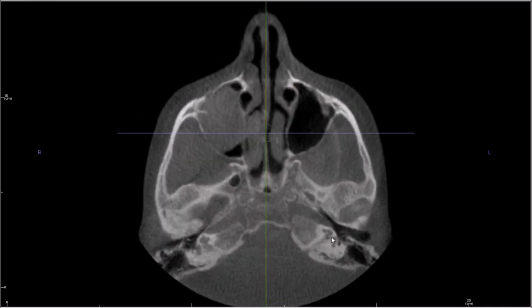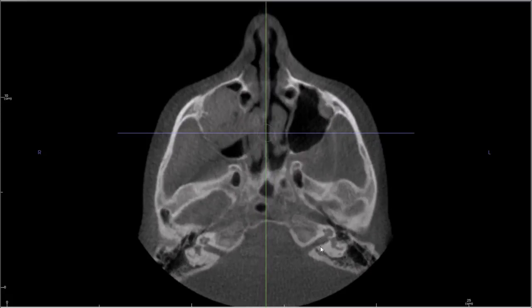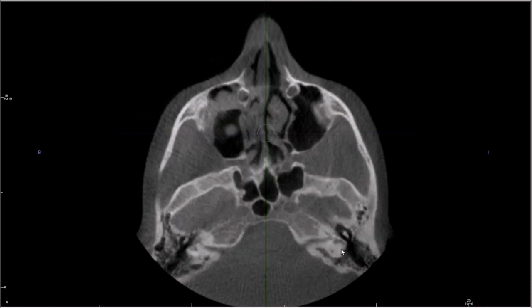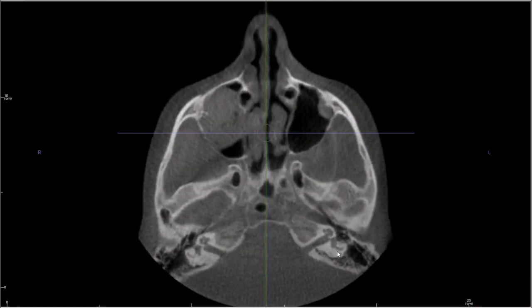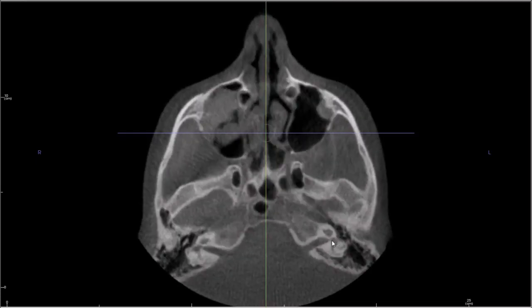So where does that lead us? Leads us into the cochlea, which is right here. You want to make sure that looks normal. And following in from the cochlea is the internal acoustic canal, or internal auditory canal. That's where the vestibulocochlear and the facial nerve travel. And then posterior to the cochlea, you see these little tubes that kind of wrap around. And those are the semicircular canals. This little opening here that joins the cochlea and the semicircular canals is the vestibule.